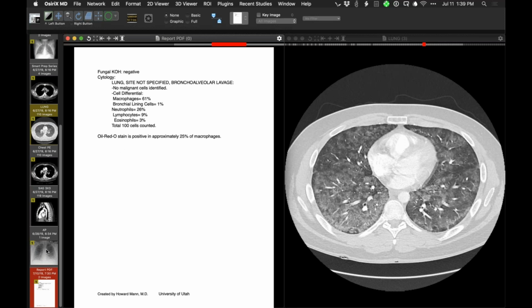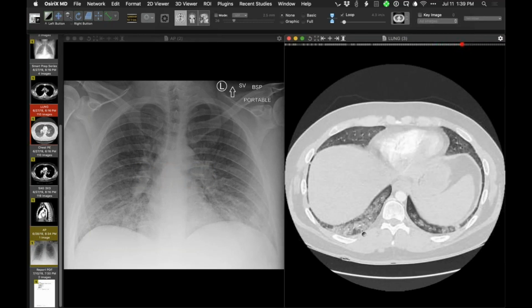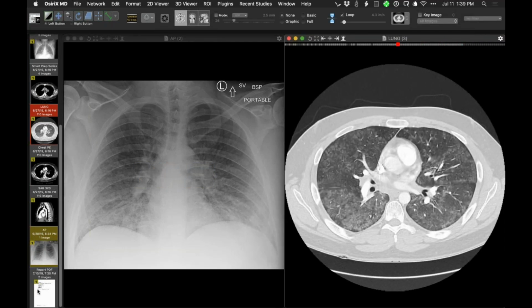And again, this is considered to be another case of vaping-associated acute lung injury. And the CT I showed you was from the 27th. Here's a chest radiograph. And he got better too and left the hospital. So there's a day between these two radiographs. So again, here, a clinical diagnosis of acute vaping-associated lung injury.